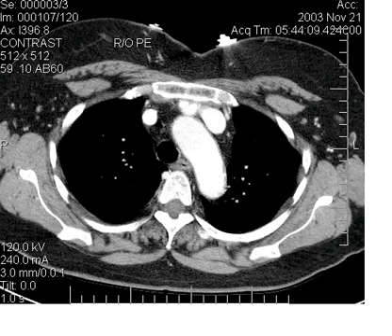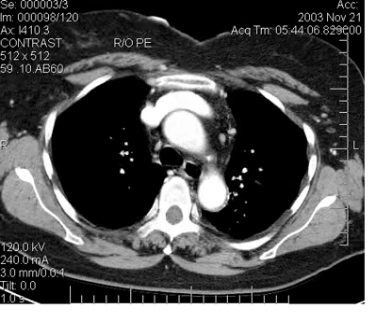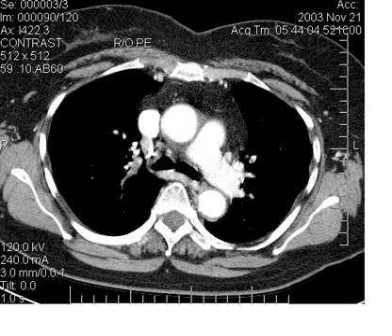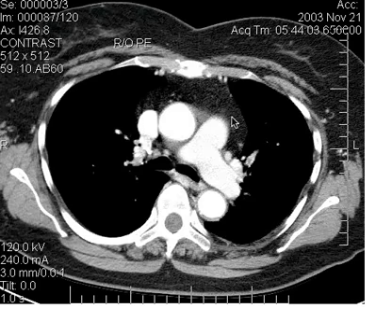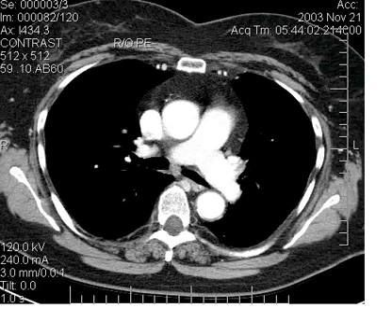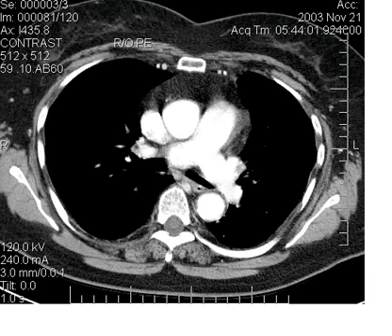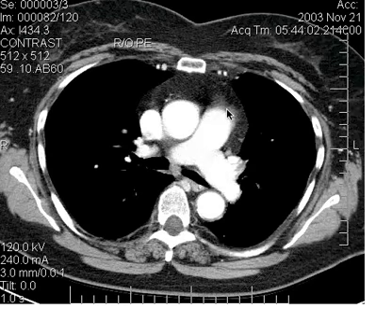And as we go down from that, we're going to see the main pulmonary artery branching under the arch. Here's the main pulmonary artery. It's branching under the arch. The left is a little bit higher, so we see that first, and then we go down a little farther, and we see the right. So now you see that Y configuration, which is kind of oblique. Here we go. Main pulmonary artery, right and left.